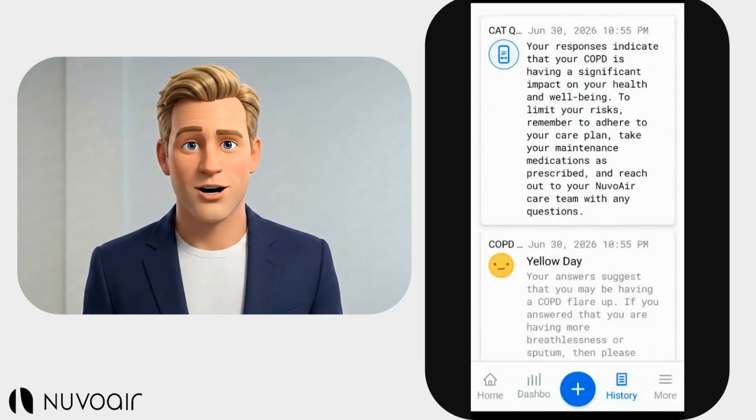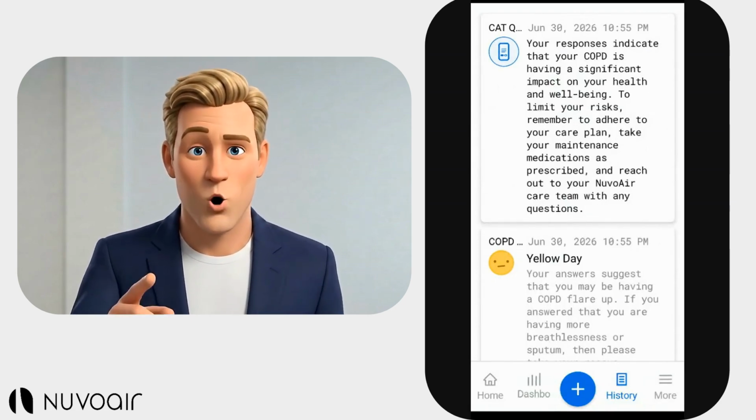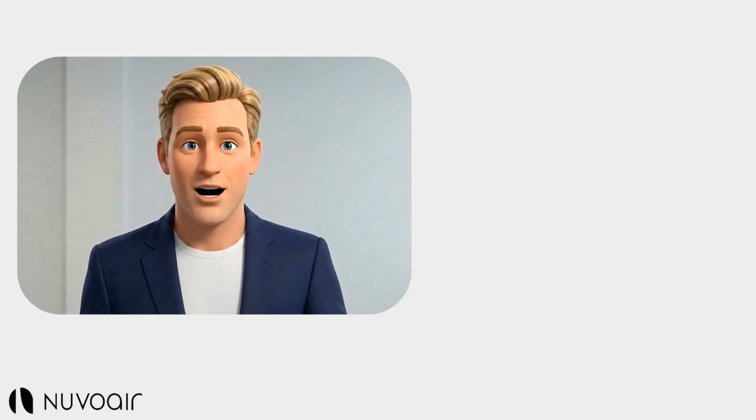Press Done when you're finished. You can check it in your history. Sometimes it needs a moment to load, but don't worry, it'll be there shortly. Next up is Keisha. She will close us out.